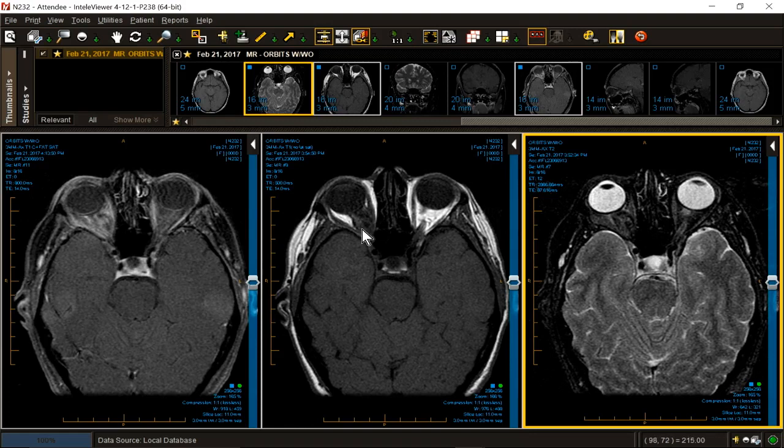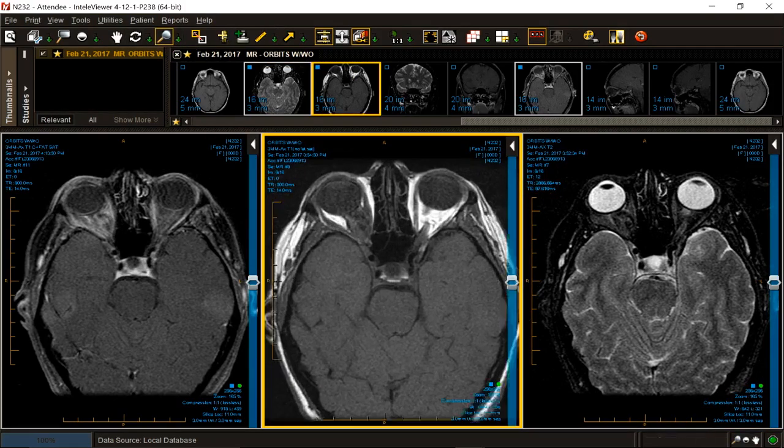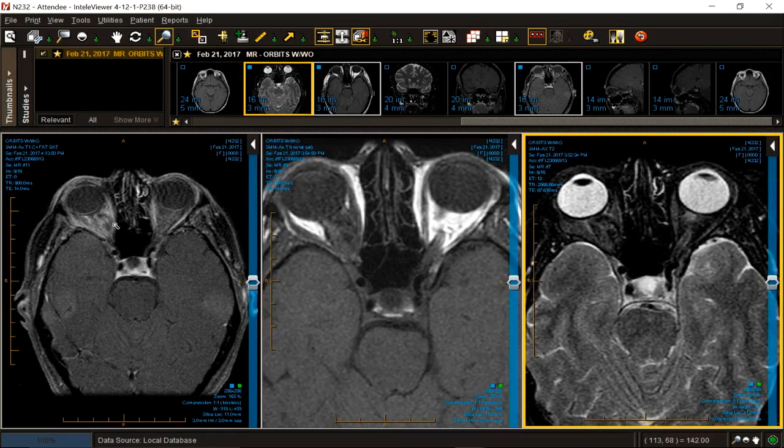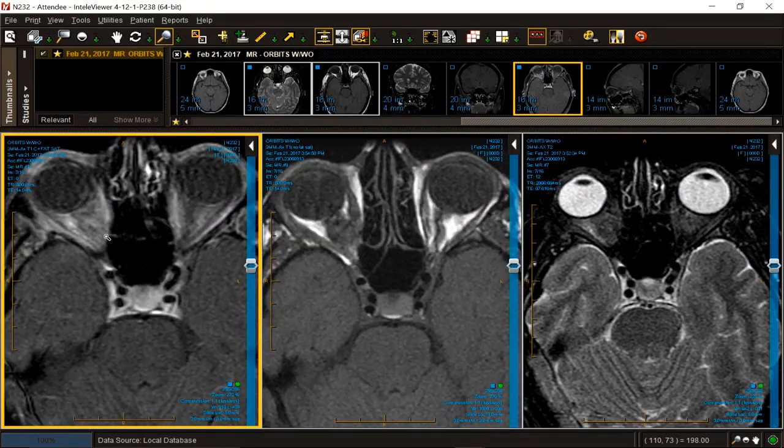On the T1, the lesion looks like it surrounds a lower signal tubular structure, although that tubular structure is encroached upon. I'll make it a little lighter. And I would encourage you to make it a little bigger. I think the T1 contrast image is a little more amorphous in terms of its diagnostic acumen and capability, but there is enhancement in a more broad sort of perineural distribution. And I think now's the time for us to go to the sagittal T2.